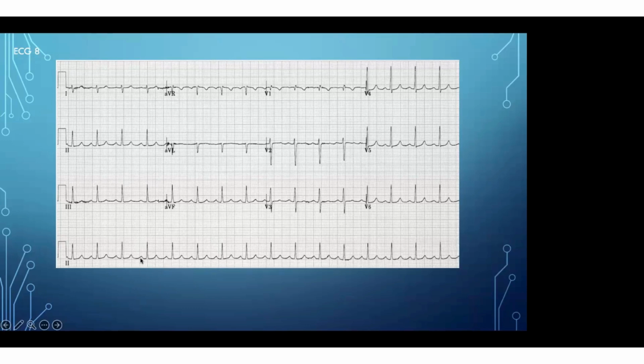The P wave is normal, the PR interval is normal, and every P wave is followed by QRS: P, QRS, P, QRS, P, QRS. In tachycardia, where the P wave falls is also important, so along with the PR interval, you should also look at the R to P interval. This is a narrow QRS, long RP tachycardia with 1-to-1 AV conduction. Usually this is sinus tachycardia, the most common tachycardia we come across in clinical practice. It is very benign, a very normal one.